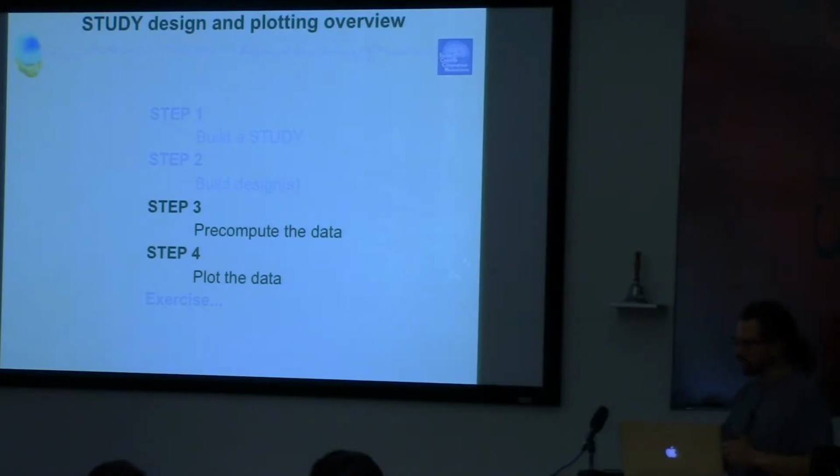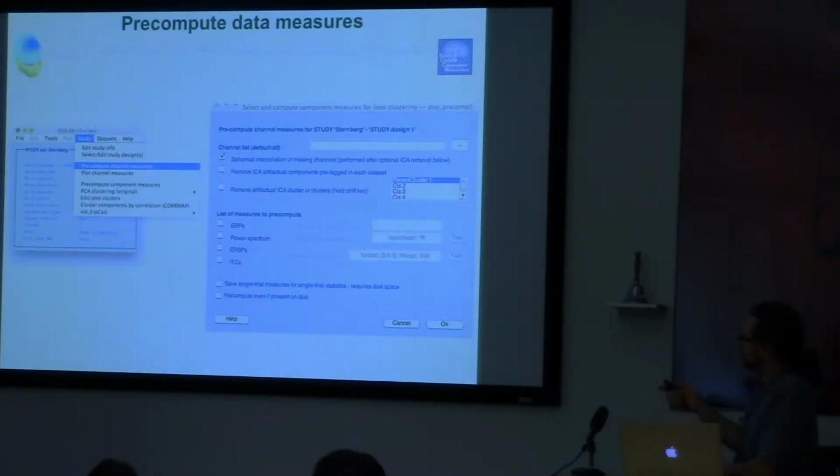So once you've done that, you created your design, then you want to pre-compute the data, because the data is usually large, and you can't read it on the fly from disk. So this is the pre-compute interface.